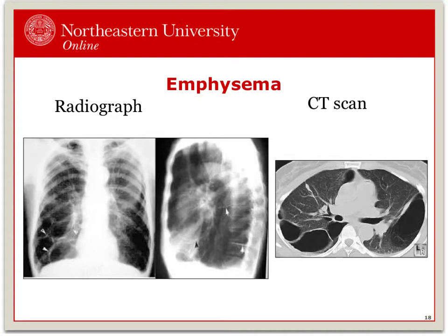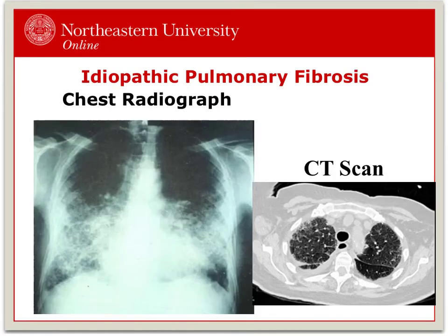In image 1, we see lucent areas or holes. This is a Swiss cheese appearance. For accurate diagnosis, a CT scan is ordered to indicate the trapping of air within the alveoli. Visualization of these images will indicate the severity and guide positioning for optimal ventilation perfusion.